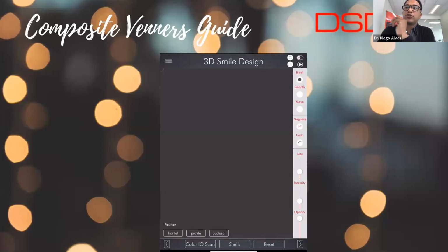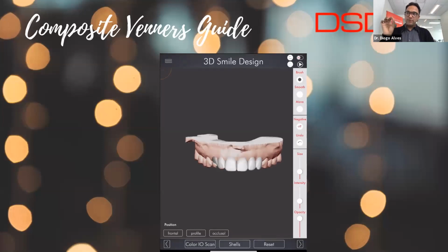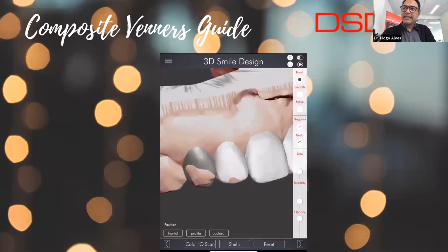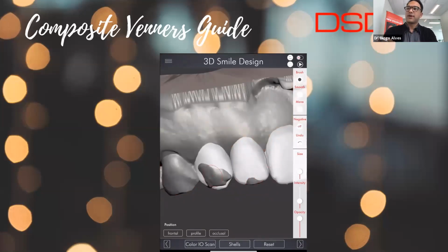and then you would be continuing in this scope tool. That's what we call it. And then in the scope tool, what will you do here? You will now be deleting, erasing this teeth that is going through that 3D design. Look at that. Wow.